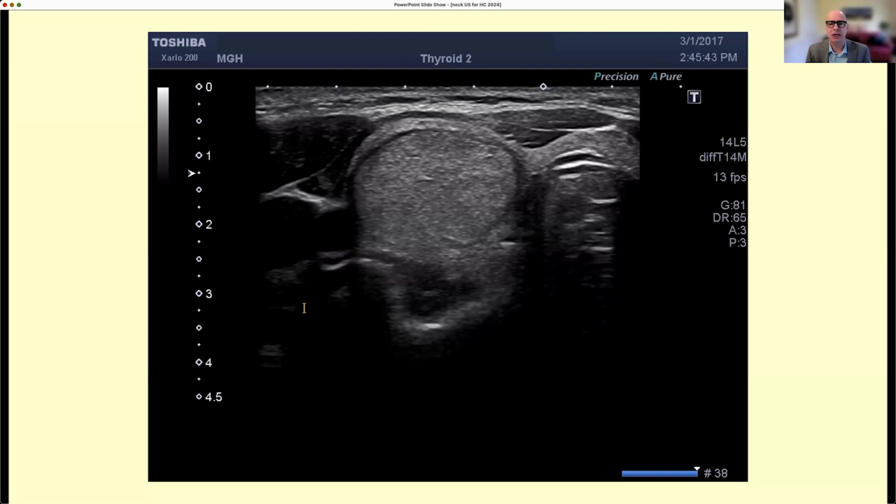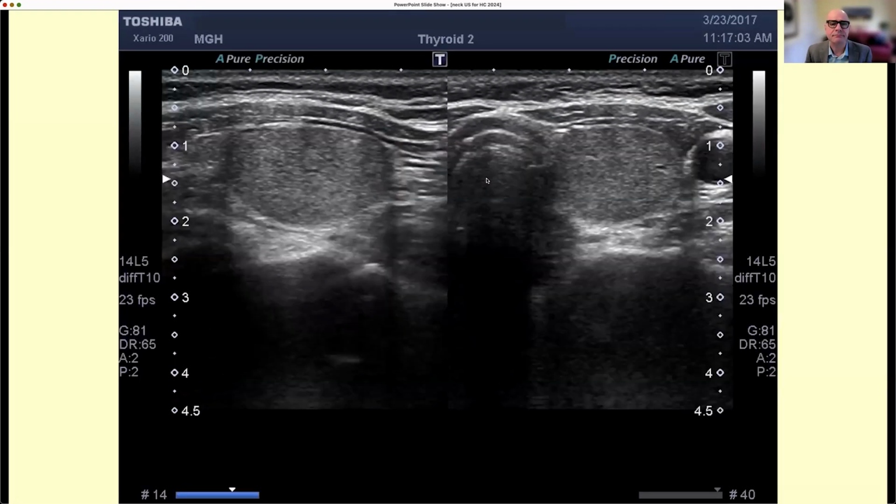And you can imagine that if you look at the histological structure, these are nodules in which the follicular structure of the thyroid is preserved, and therefore it generates enough echoes to make it isoechoic to the surrounding thyroid tissue. And so that's why we could call it follicular variant of papillary thyroid cancer, which are not papillary thyroid cancer anyways, but follicular thyroid cancers or follicular adenomas.